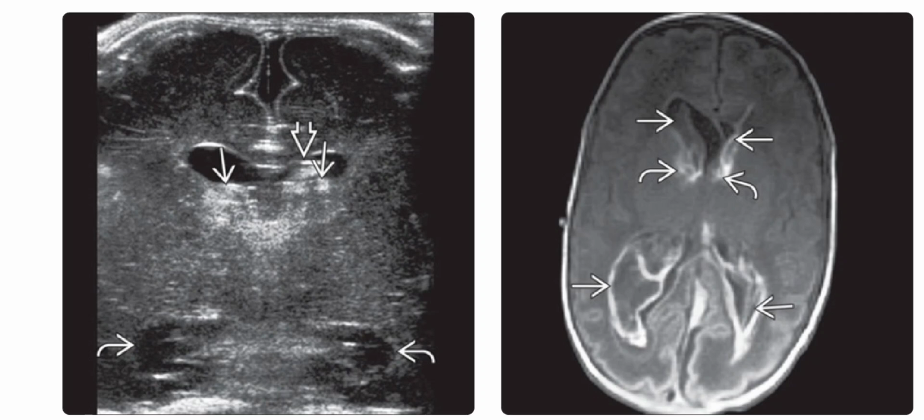Right is the axial T1 weighted MRI in a premature infant with a grade 3 hemorrhage, and it shows large bilateral germinal matrix hemorrhages and an extensive mixed intensity intraventricular clot with persistent right lateral ventricle enlargement.